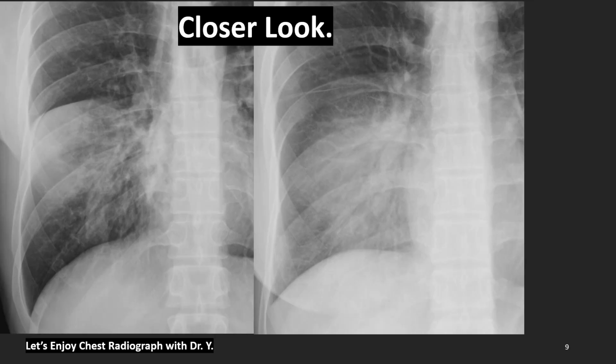Let's have a closer look. These two images have two things in common: middle lung zone consolidation and air bronchograms here, and here. Let's begin from the left image.